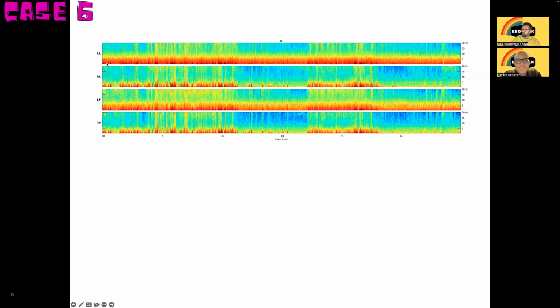So it goes all the way from 0 to around 5, right? And the power extends above, so it's probably spiky. So we have the focal, we have the spiky, it's monotonous, right? So it's a broadband monotonous pattern, but it's lateralized this time. Okay. So LPDs. Most likely LPDs, but let's look at what's going on the other side.